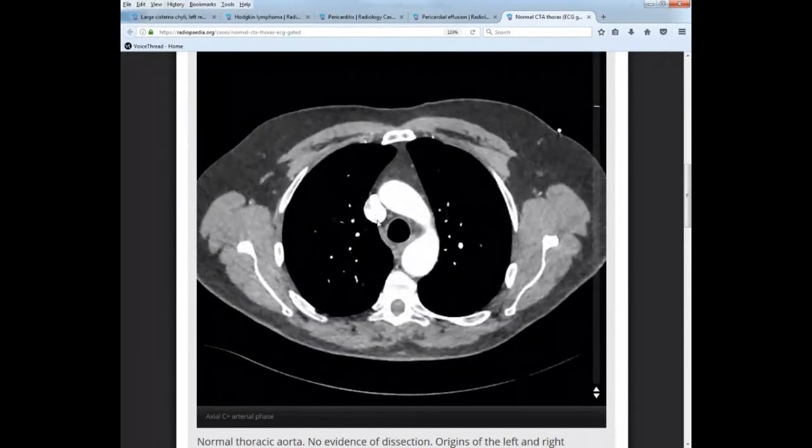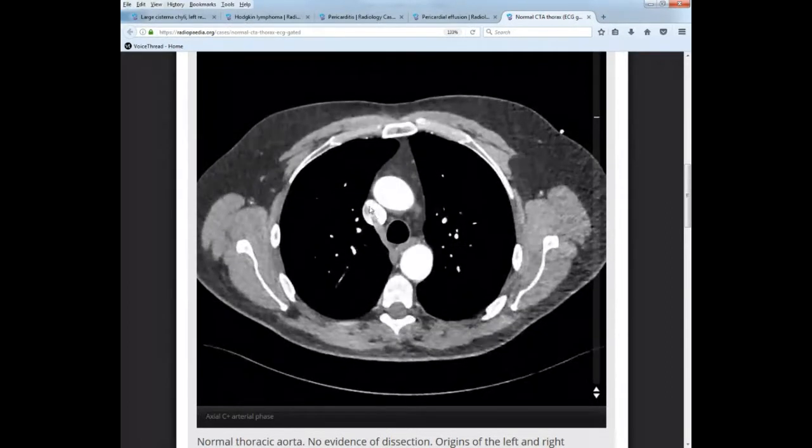So that's why you can see the deoxygenated blood looks like a filling defect. It would almost look like a clot in there, but it's not a clot. It's just because the azygos is a pretty big vessel dumping into the superior vena cava a bunch of blood that has not received contrast yet, because it hasn't gone through the venous system. So there's your azygos dumping into the posterior aspect of the superior vena cava.